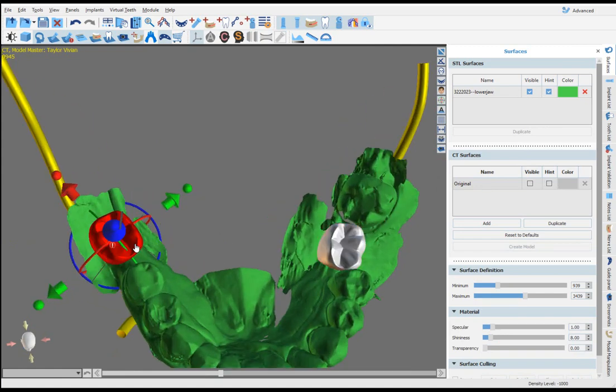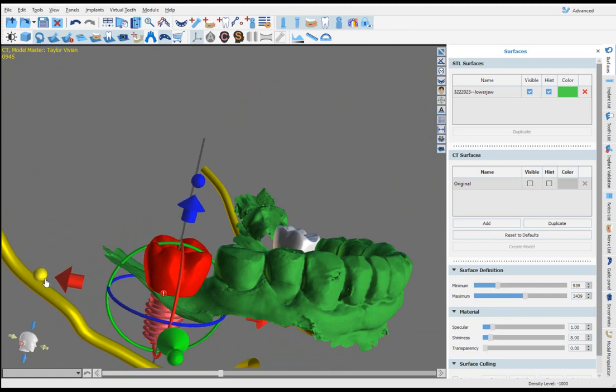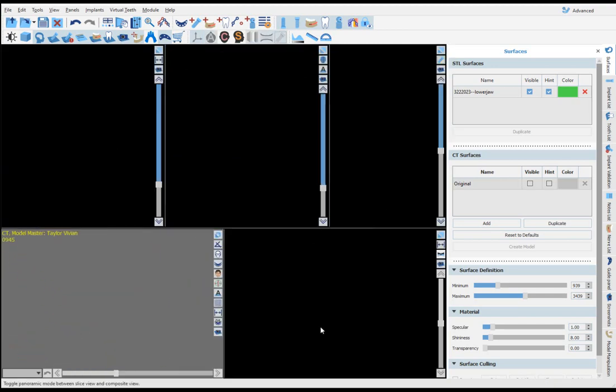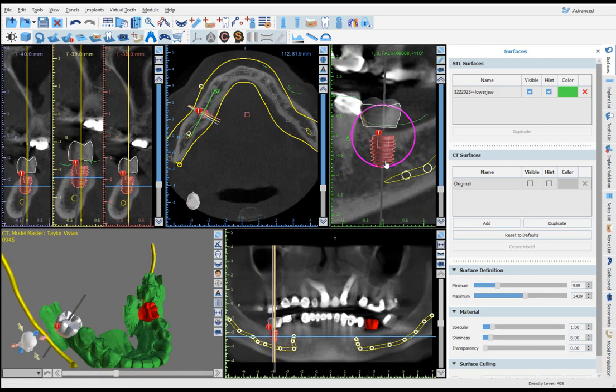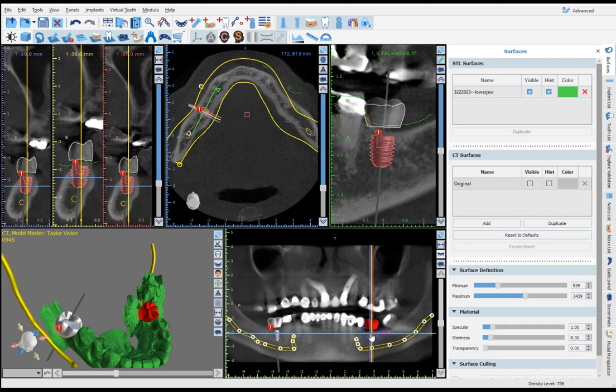So I'll need to take this tooth and bring it over, or even increase the size of it a little bit. Restorative, it looks like it's in a good position. I can bring it a little bit more over mesially just by dragging the tooth over and maybe realigning this. Do the same thing for this side.